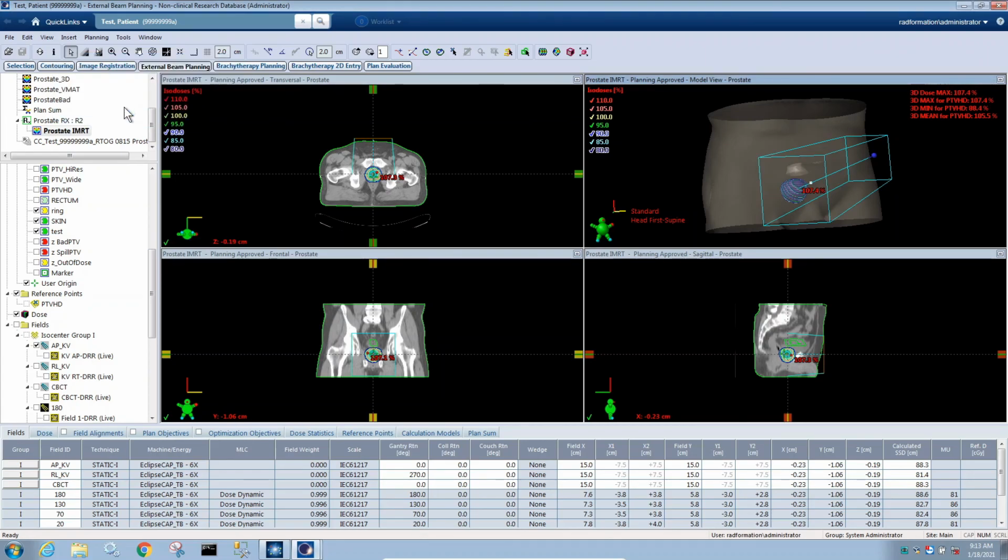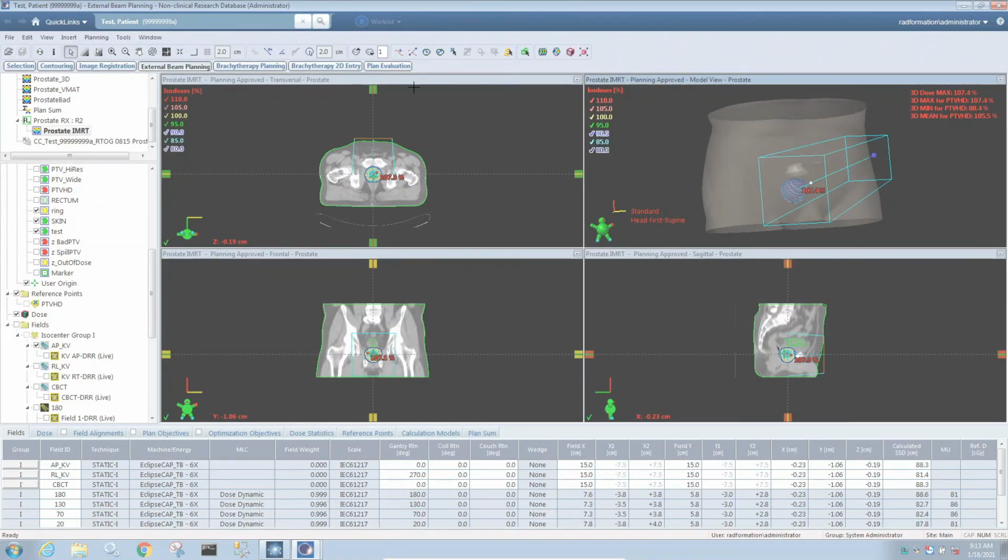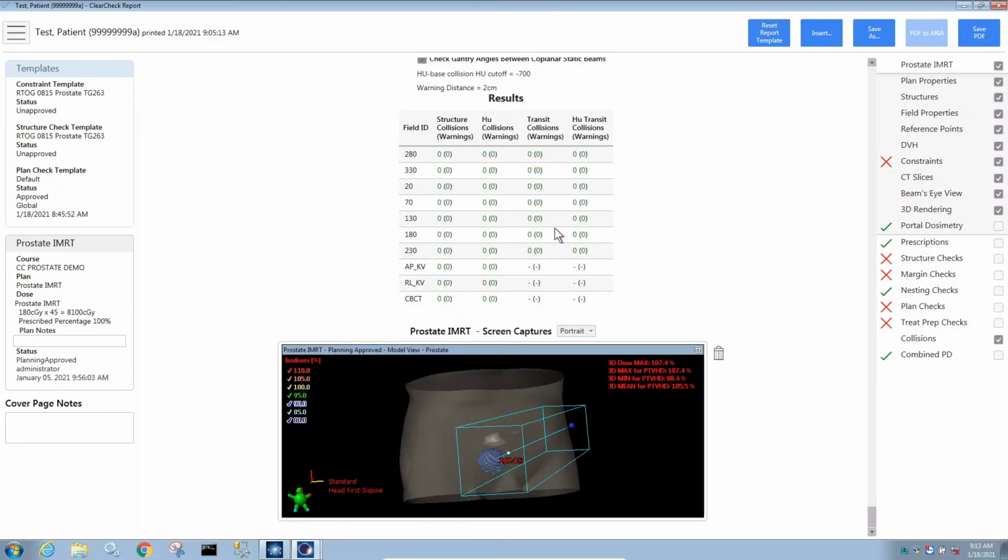If you wanted to go out of ARIA totally, and maybe you had an Excel spreadsheet or outside images that you wanted to capture, when you're ready, just say new, and this essentially becomes the snipping tool. You just click and highlight the area that you want to capture, and as soon as you release the mouse, it's going to populate here in the report for you. And now it does add it to the bottom of the report if you do it via this on the fly insert. If you are routinely wanting this opportunity to do a screen capture, then you can also add that to our report templates.